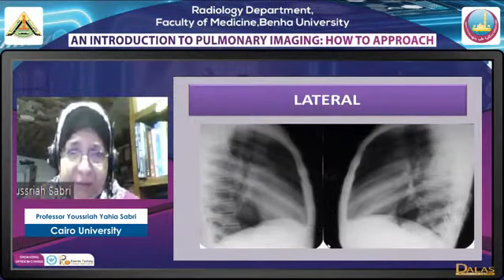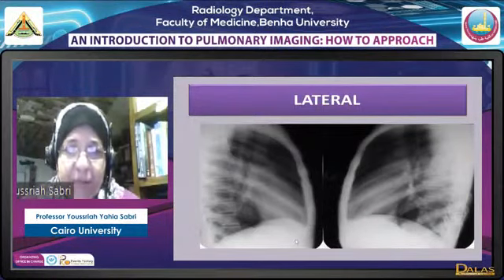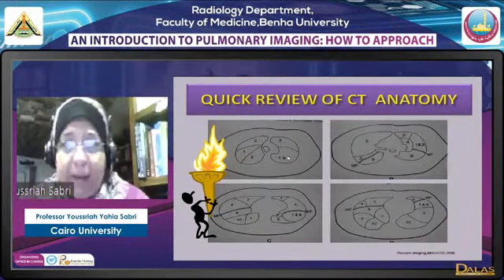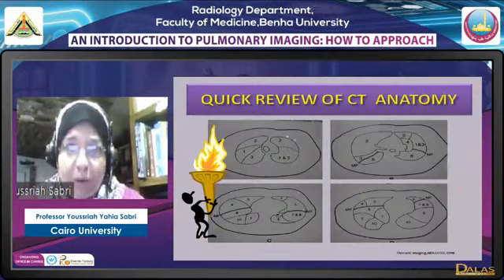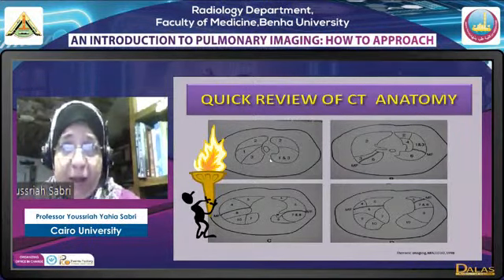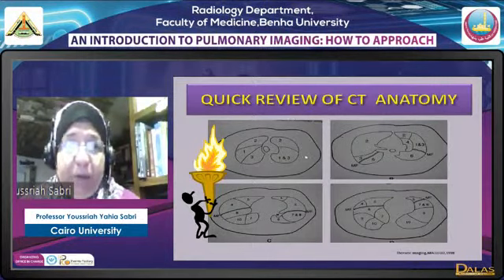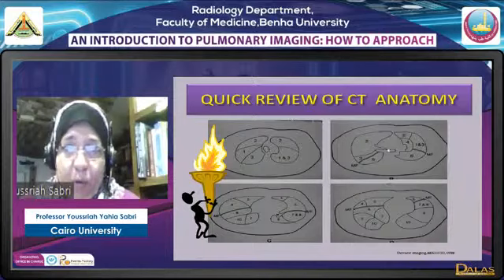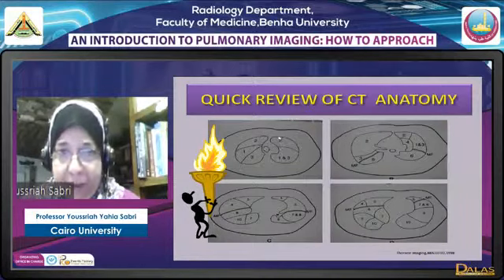Sometimes it's actually very difficult, but if they can be seen separately you can identify it. Quick review بقى للCT anatomy. طبعا الاناتومي بتاع اللنج بنبص عليه في اللنج ويند، بس عندنا 2 لاند ماركس مهمين جدا في الميدياستاينم بتخليني اقدر اعرف الليفل بتاعي. اللاند مارك الاولانيه ان انا اشوف الايرواي البلاك اللي موجود في الميدياستاينم. طول ما انا شايفه ايرواي في الميدياستاينم I'm having upper lobes on both sides.